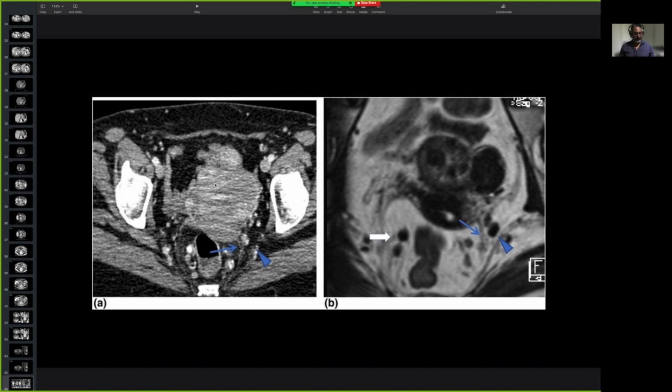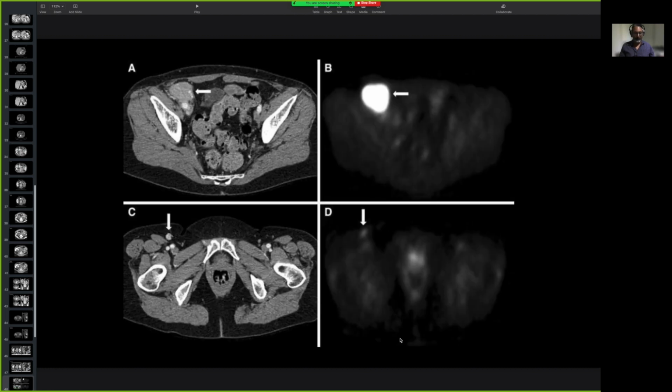Okay, now this again looks lower down the pelvis. The iliac crest is well past. And so that is around the rectum. So these look like either superior rectal or mesorectal nodes. So these are mesorectal nodes. All right, let's keep going.